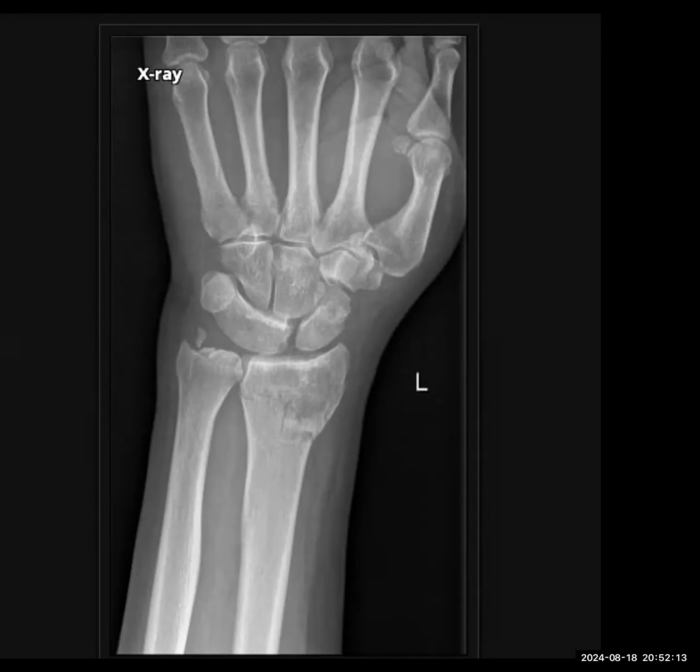So to conclude, this is a fracture involving the distal radius. I would immediately inform the findings to the clinician, and also request orthogonal views to look at any other displacement. This patient needs a fracture clinic referral. Other than that, I would also advise an MRI to rule out any associated ligamentous injury in this patient. Anything else apart from all these findings?